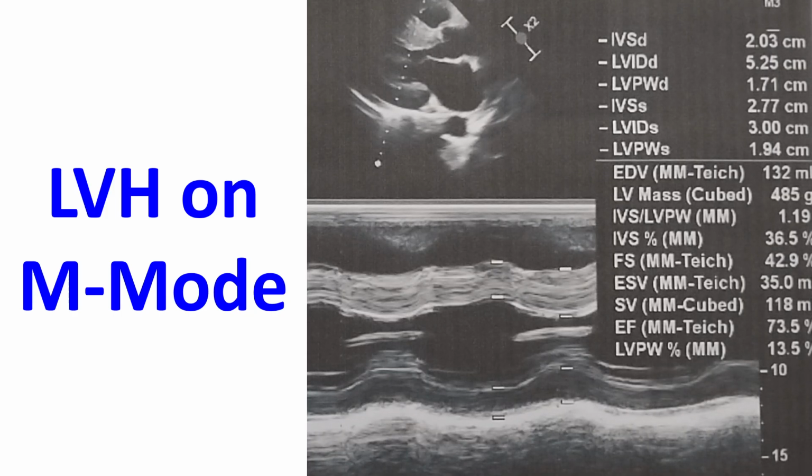Similarly, for evaluation of pulmonary hypertension, a specific pattern of the pulmonary valve M mode echocardiogram was there, but all those are seldom used these days. Still, for left ventricular measurements, M mode echocardiography is still used in most of the laboratories, even though more accurate will be 2-dimensional or 3-dimensional measurements for assessment of left ventricular ejection fraction.